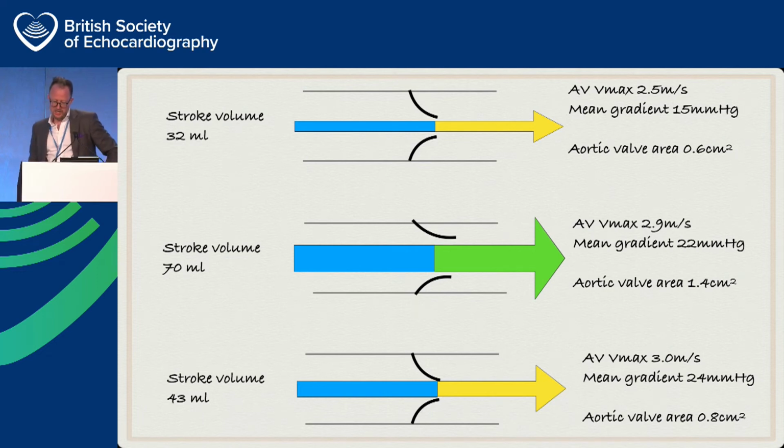But this is a slightly more pertinent one. We've got the same patient at the top, low gradient, low flow. This one, they've got completely normal, nice big contractile reserve. You can get an answer. Here, this person's stroke volume has still increased by 20%, and yet, as I said, it's nowhere near the level that we would consider normal. So unsurprisingly, the results are almost uninterpretable again.